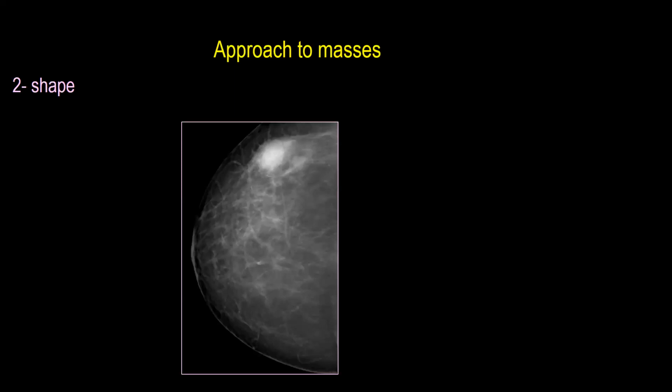Can you tell the shape of this mass? This is my patient. Irregular shape. Any other opinion? Partially obscured. Shape, irregular. Any other suggestion?